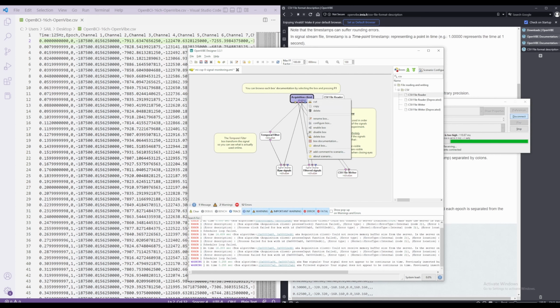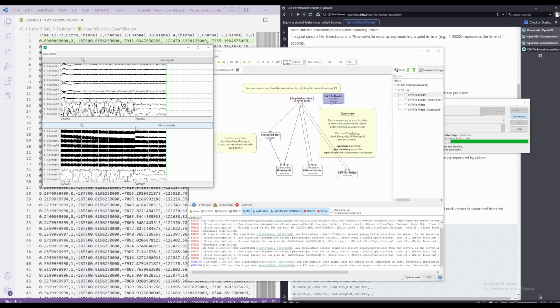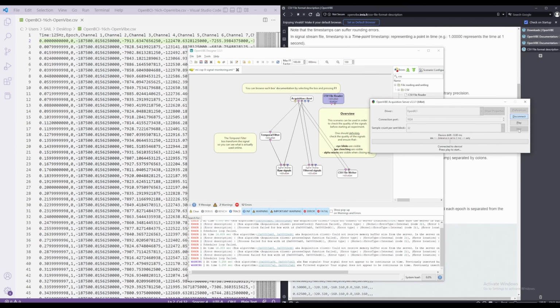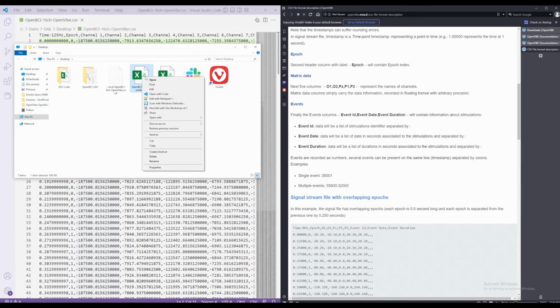And we need to enable this, disable this. There we go. Press play. All right. Yeah, here we have 8 channels plus the 3 accelerometer ones. Maybe touch one. There we go. And that's good enough. Stop, disconnect, and we go to desktop. There's our file.